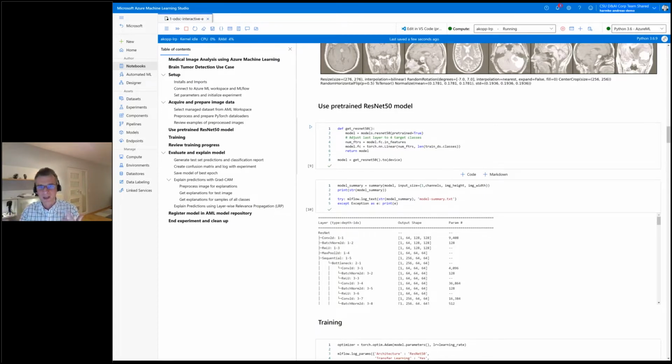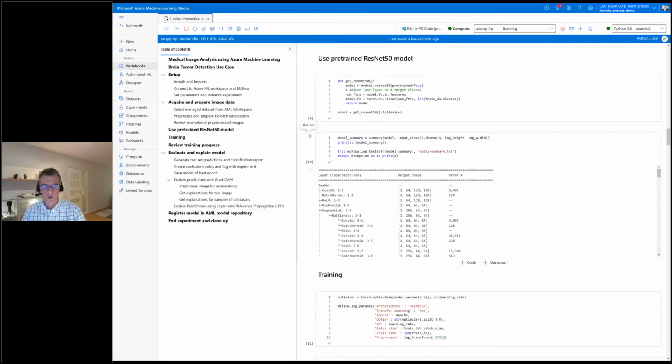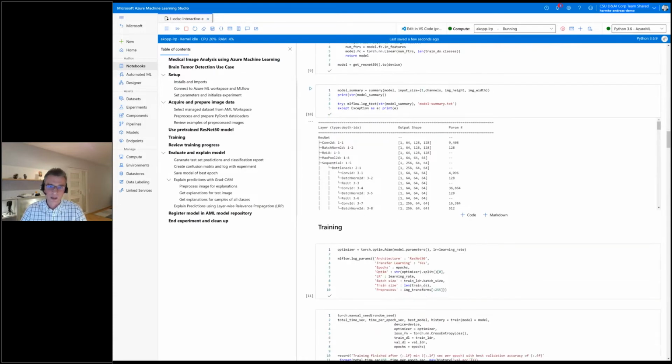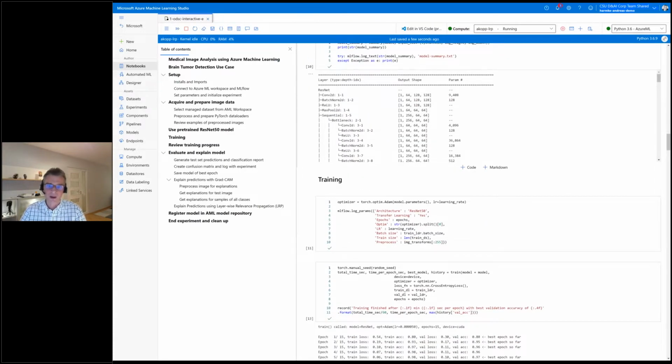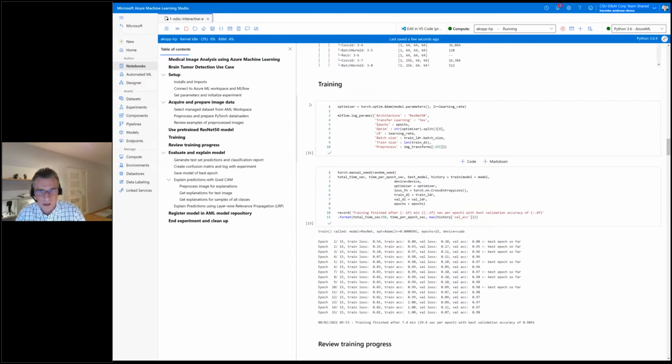But think of a medical setting. Maybe you want to combine multiple views, multiple X-rays. You build a custom model, and you also want to track the specific architecture you have developed for that. So we are also leveraging MLflow to track everything, and we will see it a little bit later in the experiment context that everything is there for traceability. This is a custom development scenario.